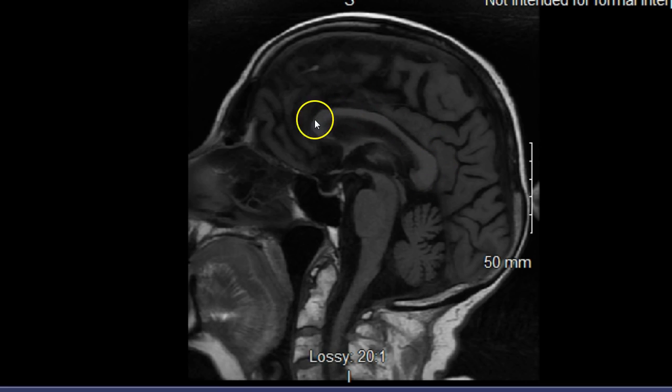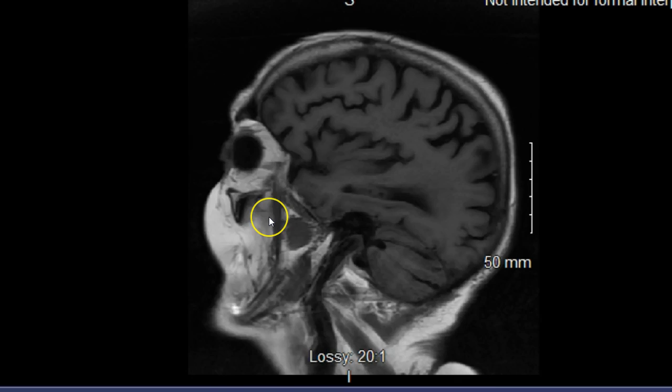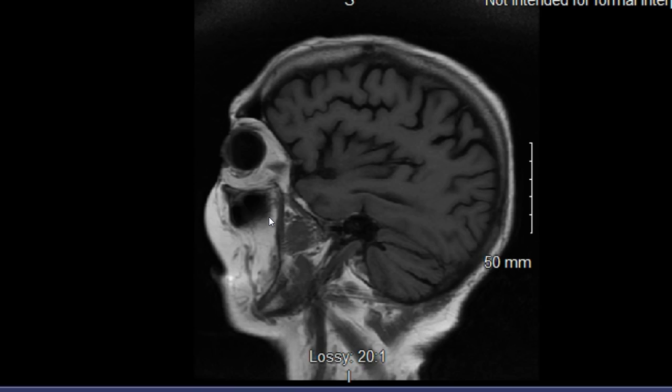So the corpus callosum is nicely demonstrated. You can see the cerebral peduncles here. So the area of the midbrain, the area of the pons, the area of the medulla, and then that solid spinal cord here as well. So cerebrum versus cerebellum, nice and well demonstrated here. In between, just specifically, just look at the divisions. You can clearly identify those. So I think the differences in appearances is definitely really pretty cool to be able to visualize these structures.